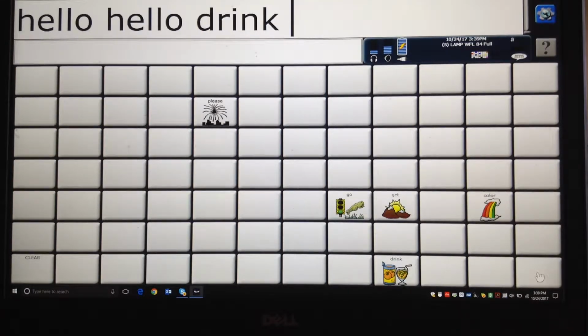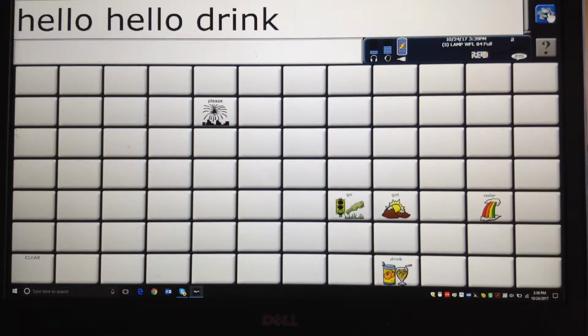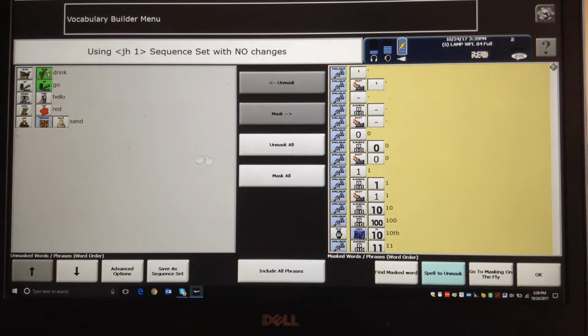Now let's say you're in this activity, and just for the sake of this, JH1 is some list that John's learned to use for some certain activity. And all of a sudden in the middle of that activity you realize that what I really like to do is tell people to stop. So you want to add to that list. To add to a list without starting all the way over, it's really quite nice. You just hit the toolbox, you go to your Vocabulary Builder menu, skip the mask all part.